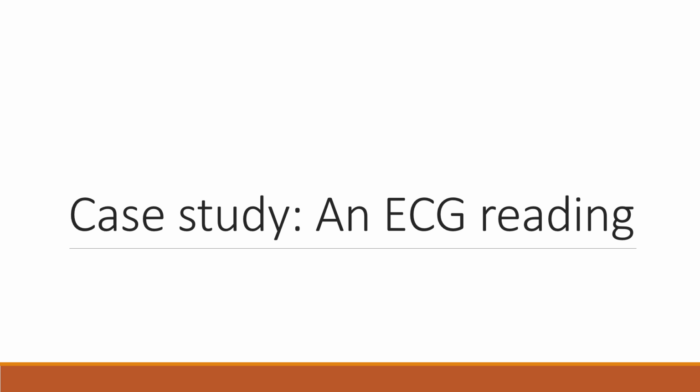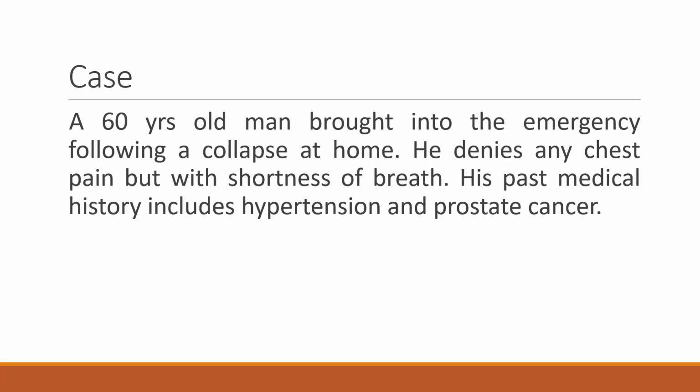Hi, today I'd like to discuss an ECG case. Like my other videos, I like to discuss everything with a case. So we have a 60-year-old man brought into the emergency department following a collapse at home. He denies any chest pain, but has shortness of breath. His past medical history includes hypertension and prostate cancer.